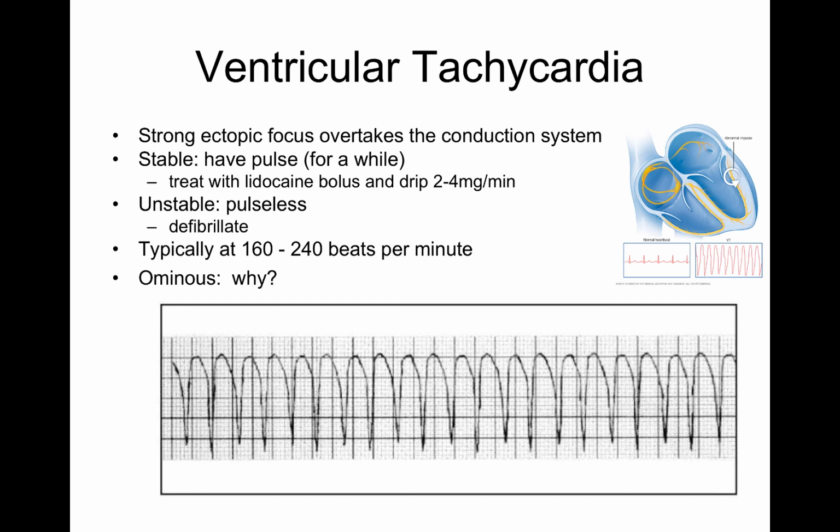VTAC is not something that's good. You can have a pulse with this. So we have pulseless ventricular tachycardia, and then we have ventricular tachycardia with a pulse.